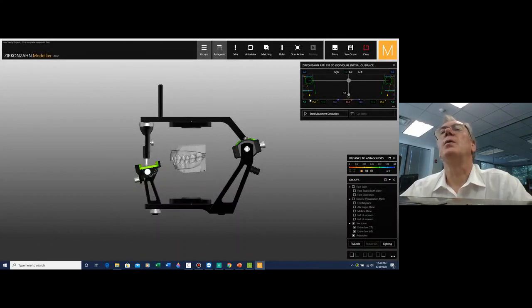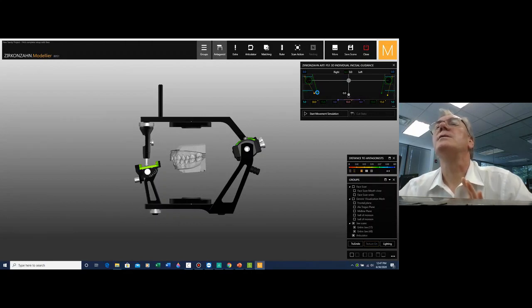As usual, you coordinate your Bennett. And again, today we are going to use, actually this is the eminence. We're going to bring it to 30 degrees. Standard values, and then the next time that we will be setting up a case, this is going to go to 15. Just a little bit of patience. Everything here is very small. I can barely see it. 15, perfect. Here we go to 15. Perfect. And here we go to 30.